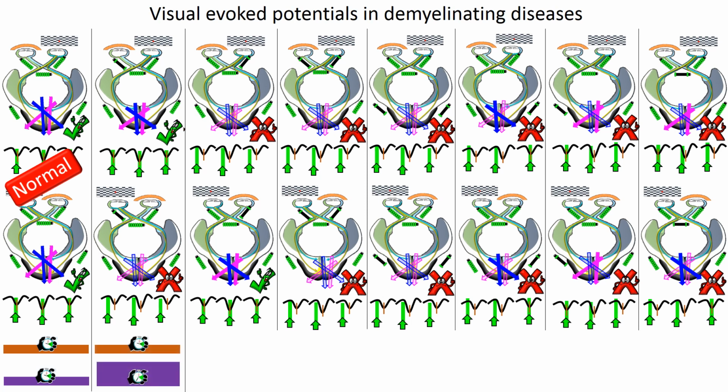In the second column, the right sagittal P100 is normal and the left sagittal P100 is abnormal. The abnormality is represented by an increase in the height of the purple rectangle and by the handle of the clock that are past the green area. This is consistent with left optic neuritis. Again, parasagittal P100 need not be analyzed in this situation.